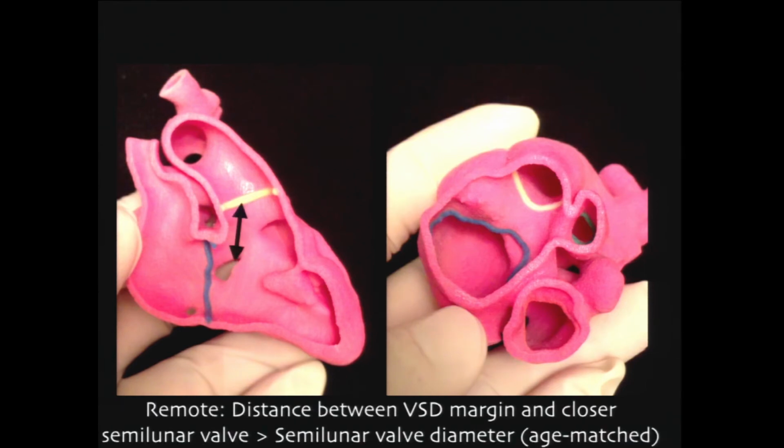Okay. So in terms of remoteness, we need to define when we really call it remote. Look at the distance from the upper margin of the VSD to the closest semilunar valve. Measure the distance, and if this distance is larger than the semilunar valve diameter, which should be age-matched, that is the definition of a remote VSD.